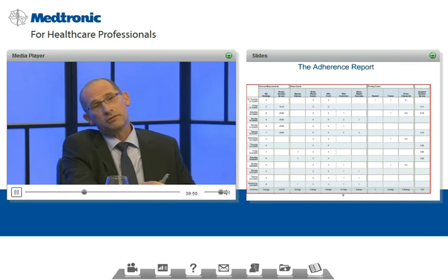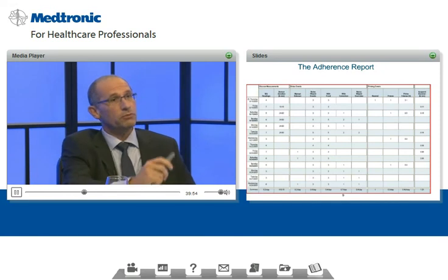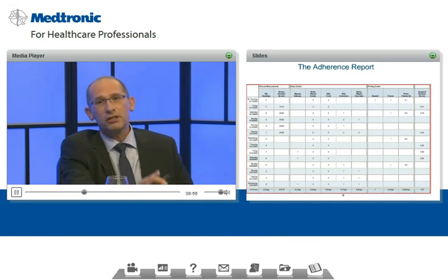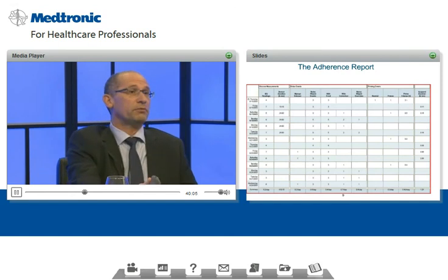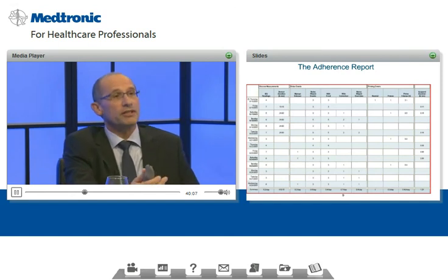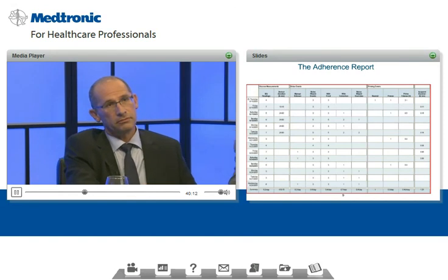It can also tell us how much the patient is using continuous glucose sensing, as was mentioned before. In order to get good results using CGM, we need more than 60 or 70% time usage by the patient. In this case, we can see that he's using it less than 50%. So he's not utilizing the CGM as required to get the best results.